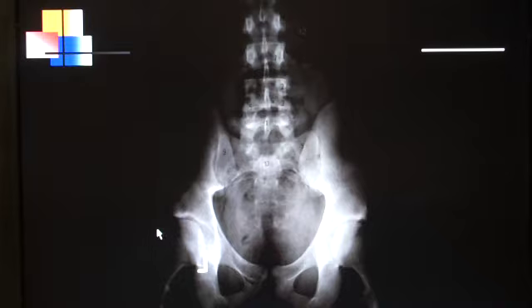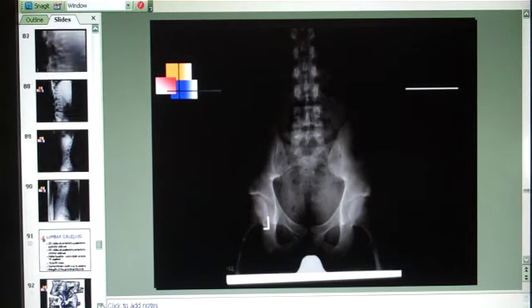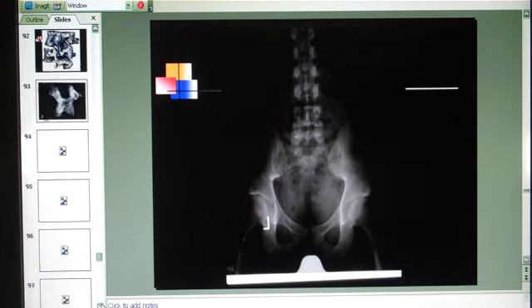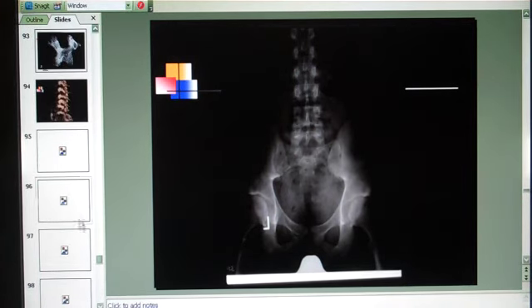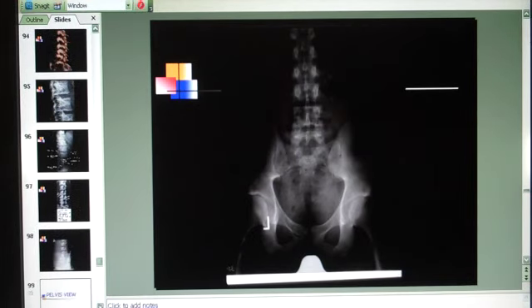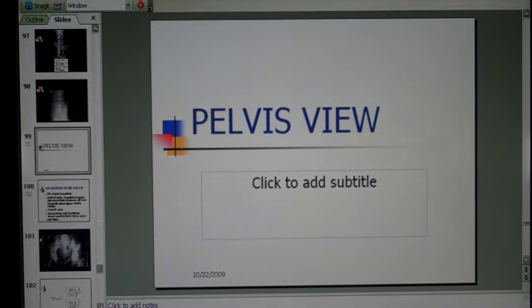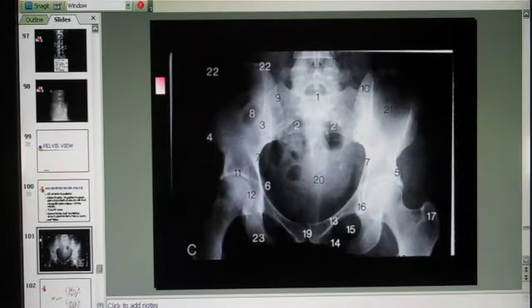And so I'm going to actually move to another film as well. If I move down to, let's see, I'm going to keep the video running while I do this rather than turn it off and turn it on. Let's pick this film right here.